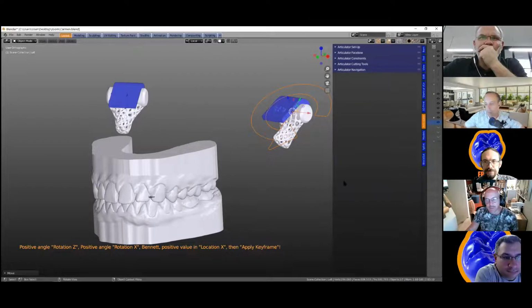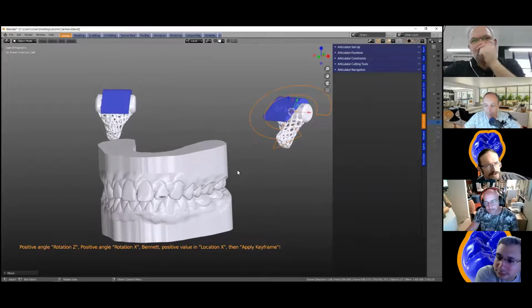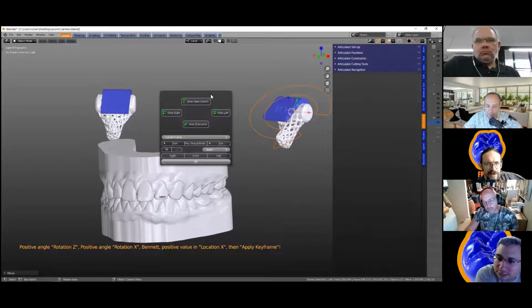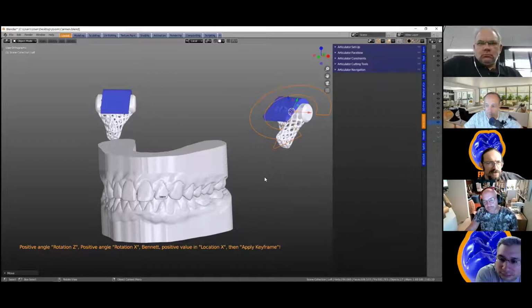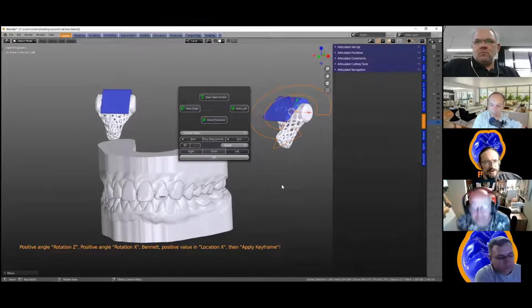Okay, perfect. So yeah, the shortcut is Control plus X. When you are in another module, you can bring back the navigation. Yes, Control X. What I don't like with this is that when you click back on the viewport, you lose it, and it's not possible to have it stuck in a pop-up.